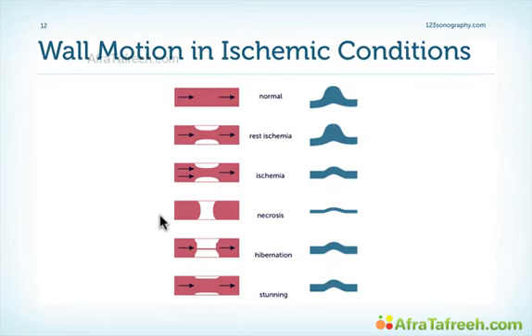If the patient had an infarct, there is an occlusion, then there is akinesis and the wall is thin. If there's an occlusion which occurred slowly or there's some form of collateral flow, then there is hibernation. In other words, the patient did not have an infarct. The segment is still adequate with respect to its thickness, but hypokinetic.